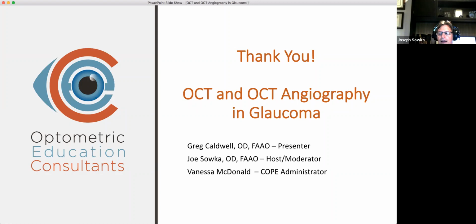One thing I want to throw in here, because we didn't have time to talk about it, and this is one that I do. Some interesting studies came out looking at what is the most sensitive parameter on the Zeiss OCT for identifying nerve fiber layer defects in glaucoma, in comparison to the gold standard of red-free photography. When they looked at the clock hours and the TSNIT quadrants, they found that the thickness map was actually the most sensitive. So actually looking at the picture on Zeiss was very, very helpful.